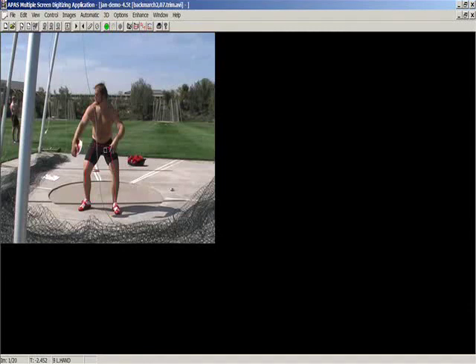You see it's automatically connected because it's the standard model of the person. It tells me to go to the left hand, left wrist, elbow, shoulder, and then the right hand, right wrist, elbow and shoulder. Again, it will connect it. It tells me to go to the chin and the forehead and the discus. So this is frame one.